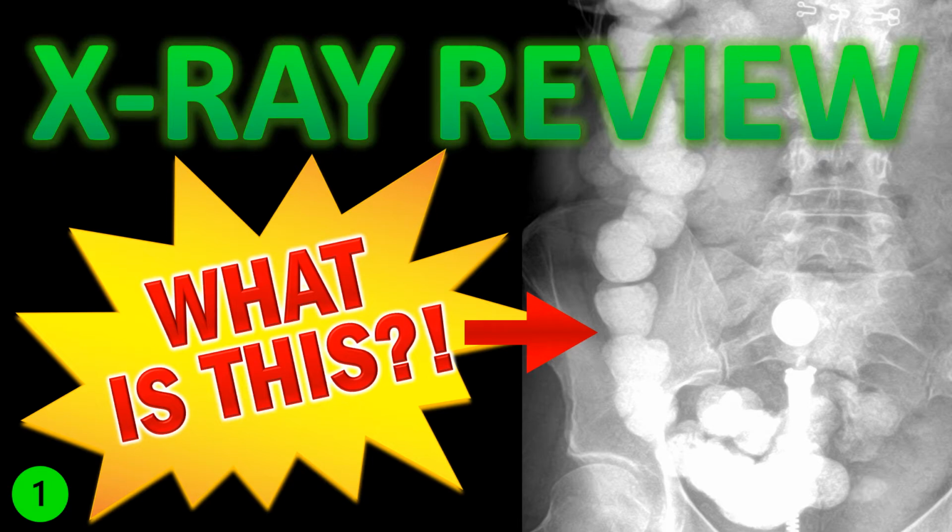Welcome to X-ray Review. So what is this? There's a large white density seen overlying this lumbar spine and pelvis, and this video is about what this density is and multiple examples.